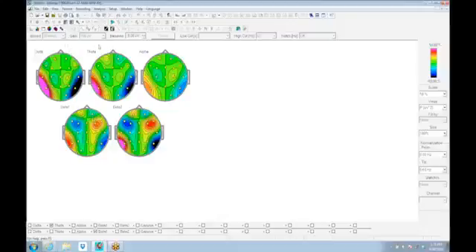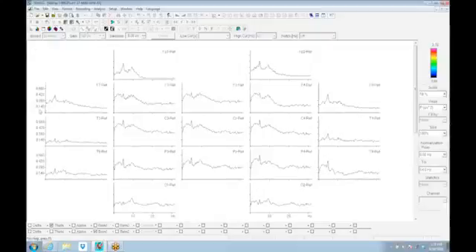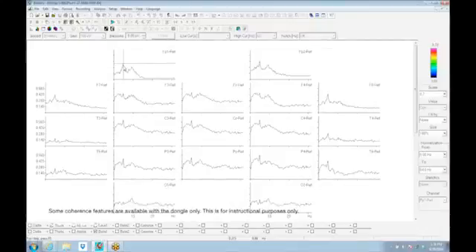In the display, we also have average coherence as a display. This is raw coherence. It goes from 0 to 1. And as a rule of thumb, coherence above 0.5 or below 0.1 tends to be outside of a normal range. And here we end up having coherences that are at 0.37. You can see the numbers down below. You put the crosshairs on, you read the numbers down below.